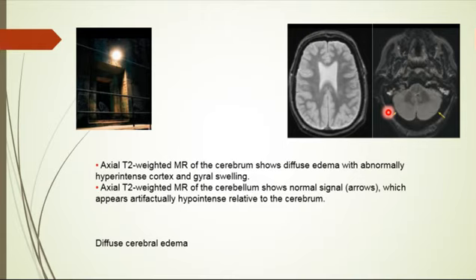Both of them are T2, due to diffuse cerebral edema. This occurs in various settings, including trauma, hypoxia, ischemia, and infection.